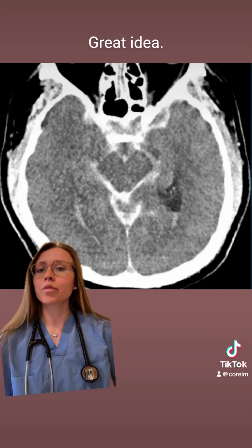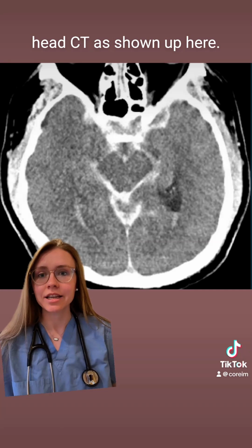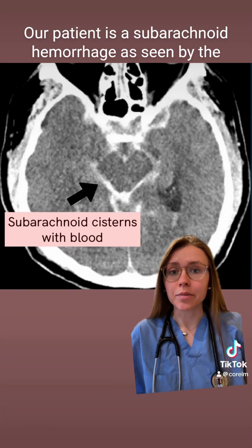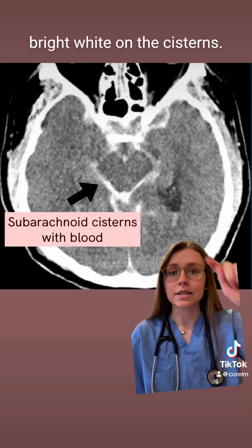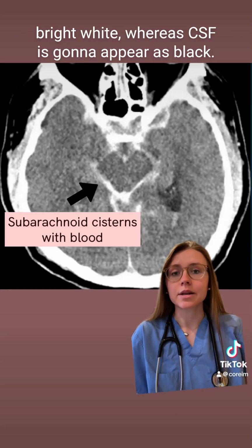Head imaging, great idea. The patient is taken for an urgent non-contrast head CT, as shown up here. What do you see? Our patient has a subarachnoid hemorrhage, as seen by the bright white on the cisterns. Remember, on a non-contrast CT, blood will appear as bright white, whereas CSF is going to appear as black.